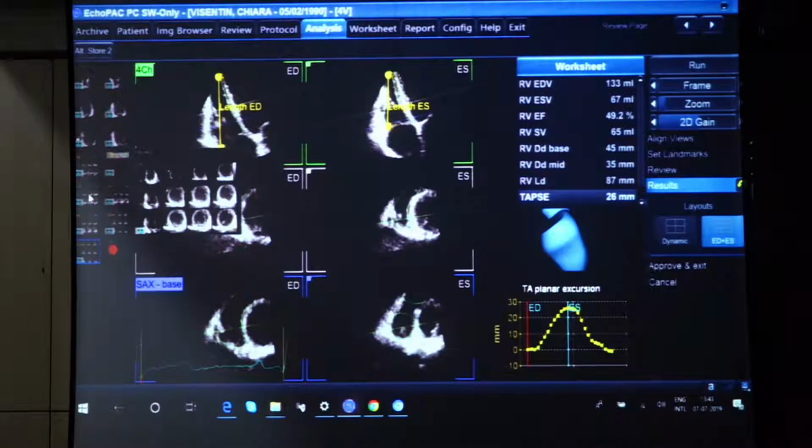Probably here I can move a little bit, really at the annulus plane. Oh, nice. Okay. And also here. I just didn't know how to move that. I got it. Yeah, you have to click and drag. You can drag and edit. Okay.